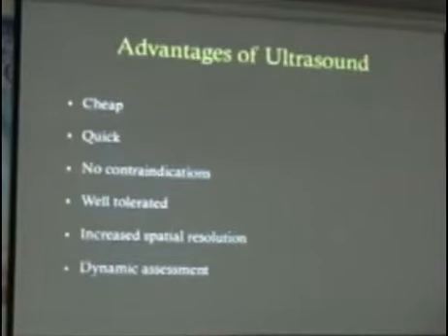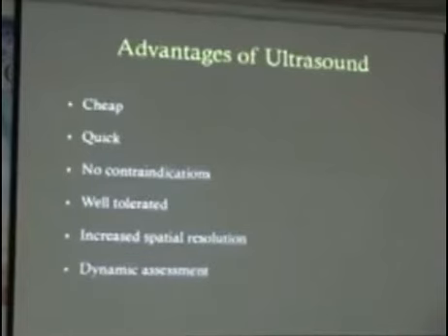So the main advantages of ultrasound is that it's quick, it's cheap, it's very well tolerated, and once again we're able to use the dynamic assessment to figure out if there's any structural changes that are hampering the dynamic function of the knee.